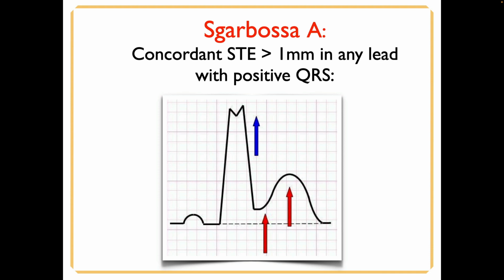And the smart thing to do is to circle them. There'll probably be 4 or 5 or 6 throughout the 12 lead. So with appropriate discordance, if the QRS is positive, Natalie, what would you expect to see? Negative. Yeah, you would expect to see ST depression.